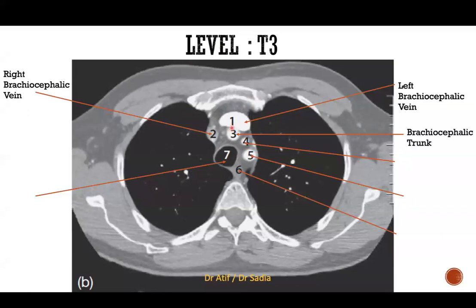And as we said, this is the brachiocephalic trunk, the left common carotid artery, and the left subclavian artery. And this is the esophagus. Again, I told you guys the esophagus is the most posterior, and it's right next to the vertebra always. So this is a nice identifying feature of the esophagus. And I also told you guys that the trachea and esophagus are friends. They run together right in front of each other. So this is the trachea, okay?